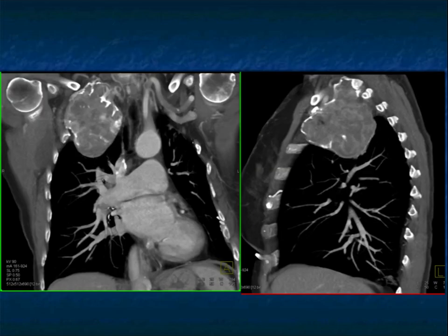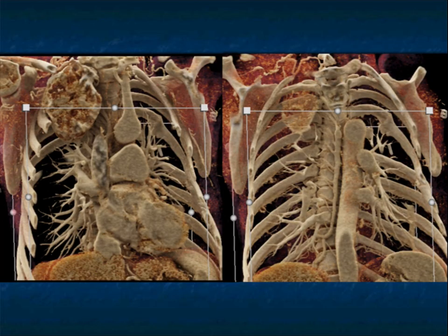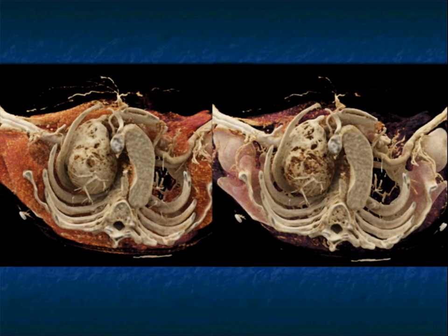Here's just a beautiful, again, think about a Pancoast tumor. Think about an eccentric anterior mediastinal mass, though maybe that's stretching it a bit, but this is a beautiful example. And on the volume rendered views, look how nicely we see those trabeculations. Really very impressive, an example of fibrous dysplasia. Here it is very nicely shown on the cinematic rendering. Just a really nice example. And here it is from below.